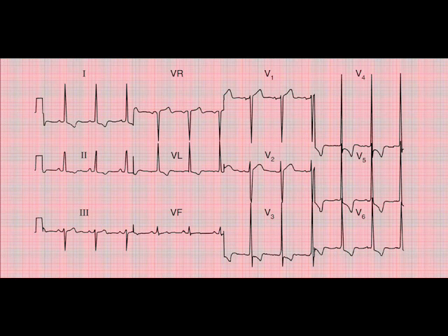Is the patient in sinus rhythm? I'm looking at lead 2 and remembering if they're in sinus rhythm in one lead, they will be in all leads across the 12 lead. Yeah, they're in sinus rhythm. Be confident there. Maybe that P wave's a little bifid, a little odd shape, but it's okay to me. It's rounded and it is just coming before the QRS complex.